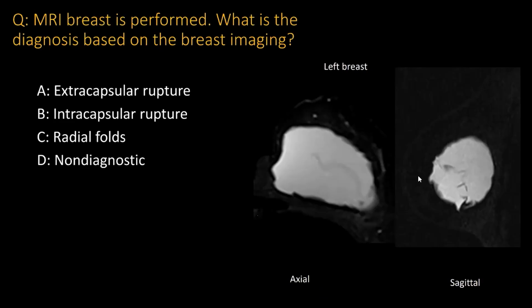And what's your diagnosis based on this MRI? Yes, you guys are definitely right. Those are the intracapsular rupture.